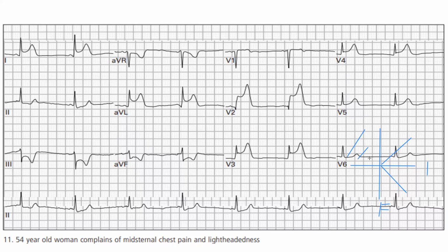We've already discounted these two. And like I say, you can use any method. This is just a very visual method of seeing it. So we know for sure we don't have a right axis or an extreme right axis. Now we look at lead aVF. Which way is lead aVF pointing? Difficult to say, isn't it? It's mostly negative, but when you look at this one, it's almost biphasic. Agreed. So what does biphasic mean?